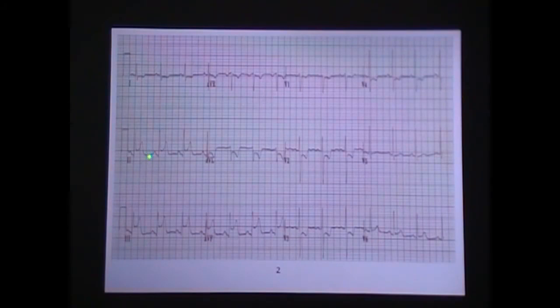Then I'm going to go to lead 2, my P waves, they're a little big. I don't really care. I've got an inferior, but I'm still looking. My QRS complex is narrow. It's just a flipped QRS, not a bundle. So right there we've got an inferior. Okay, and then I might look at the QT a little bit. RR less than half. Boom. Okay.